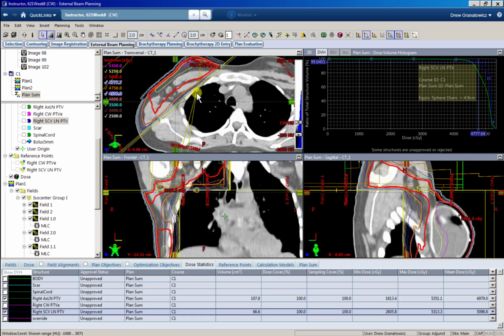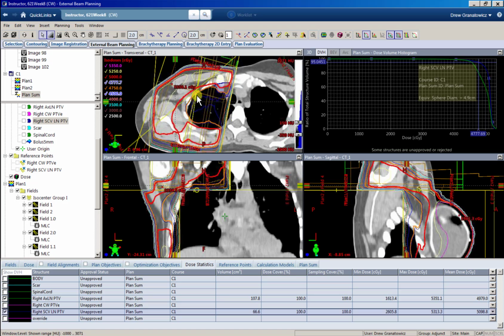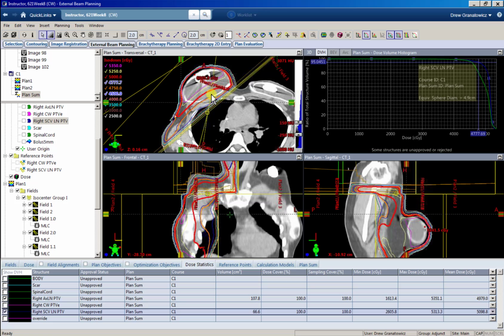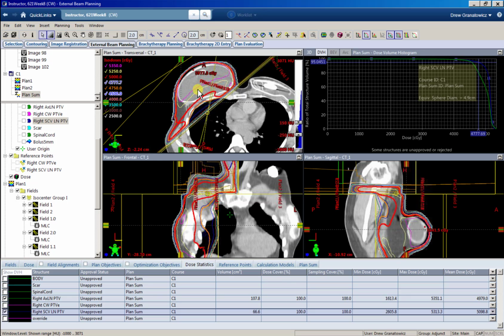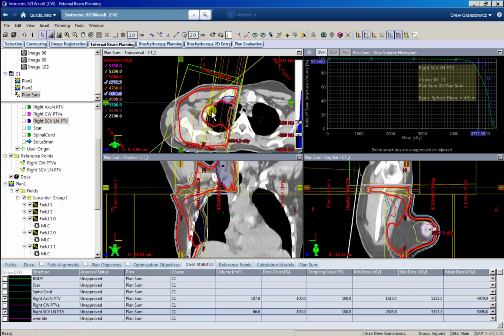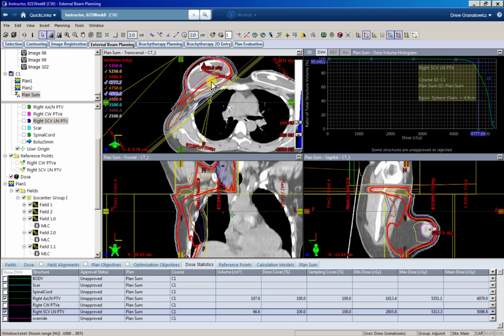It looks good. It's gonna start to break up once you hit the lung here and get closer to your isocenter, but that's to be expected. That's normal. All right, now on to our tangent fields. So the first thing we do on any plan, I kind of looked at that a little bit. I just didn't mention it up here, but you always adjust your weighting if you need to.